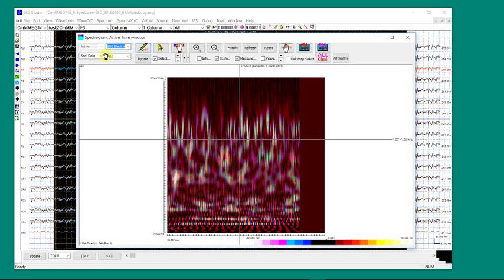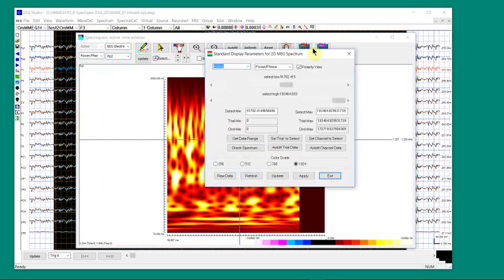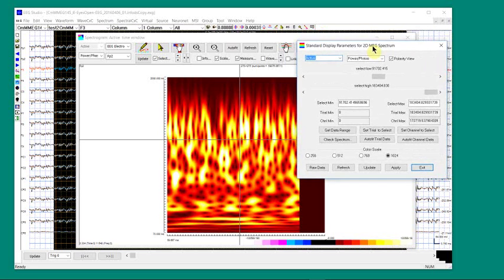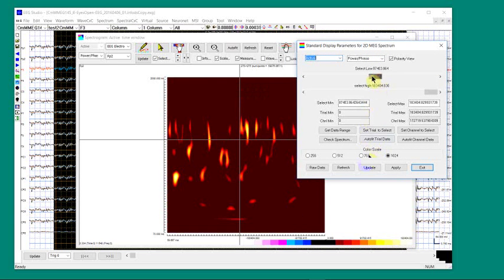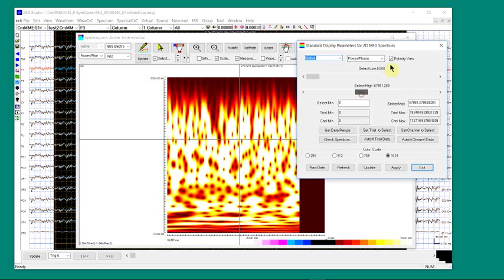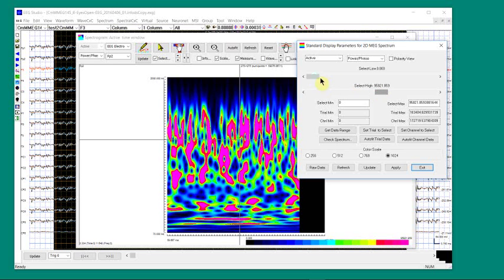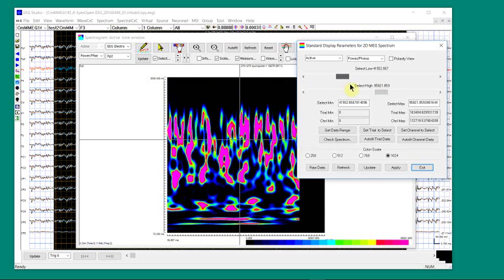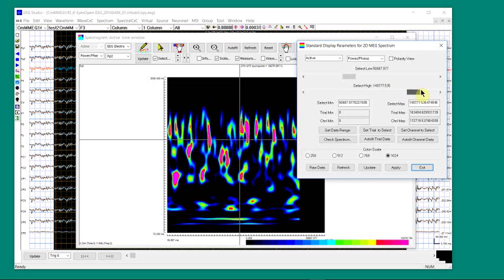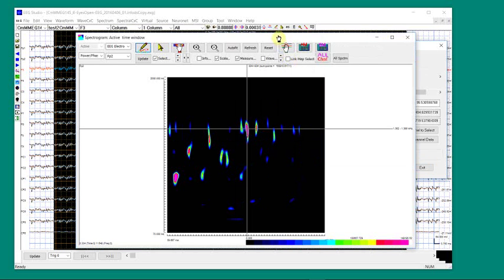This will allow us to define the display of the data. For example, you can increase the power, adjust it. You can remove the polarity, depending on what you need. Say the spectrum, they will change. So you know where the power is, the peak of the spectrum.